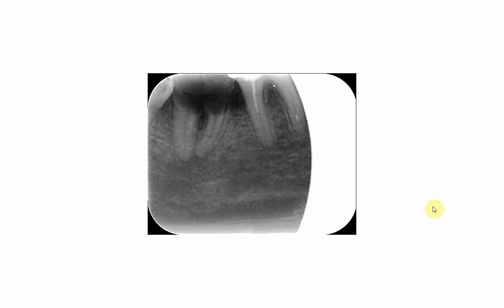In this radiograph, the contrary has happened. See that all the crowns of the teeth in this periapical area were cut off, and the film has extended too much down. See this radiopaque area? This is actually the inferior border of the mandible.